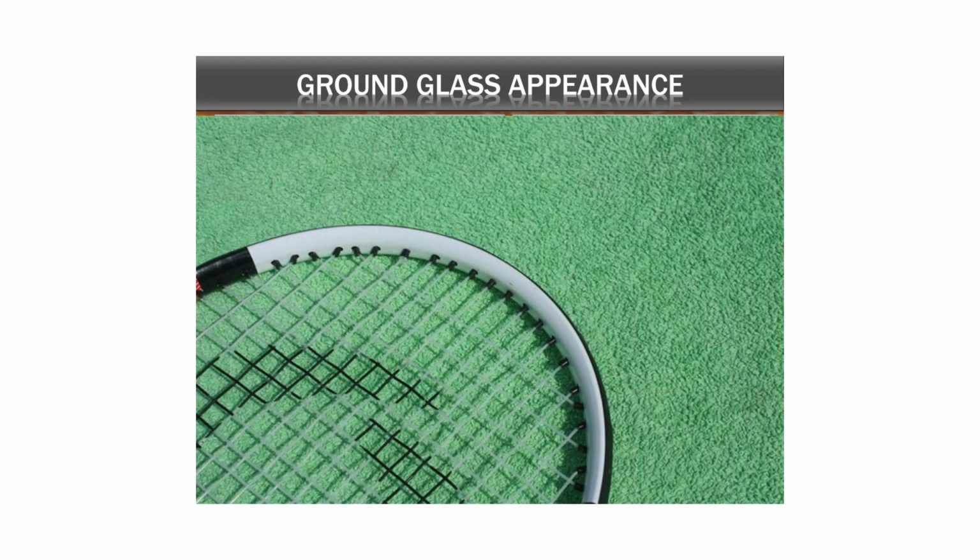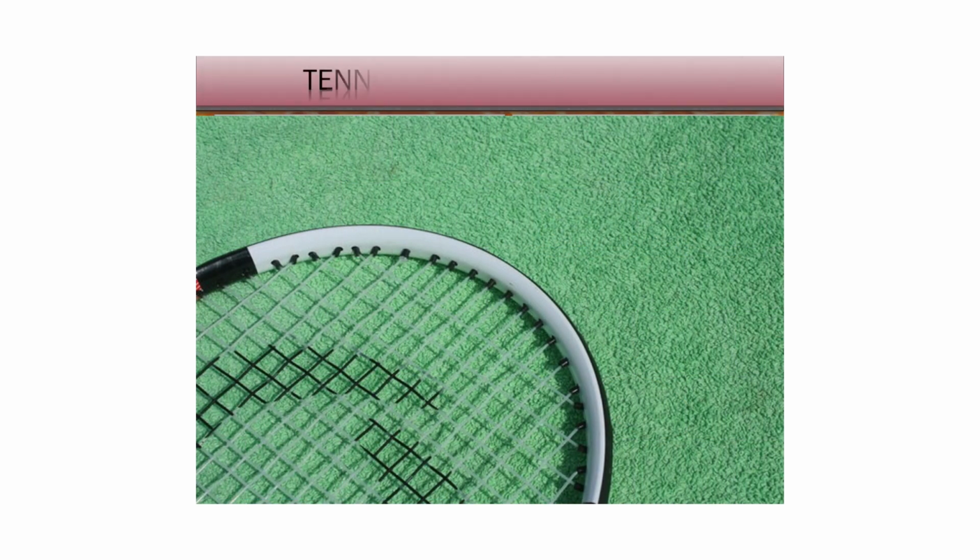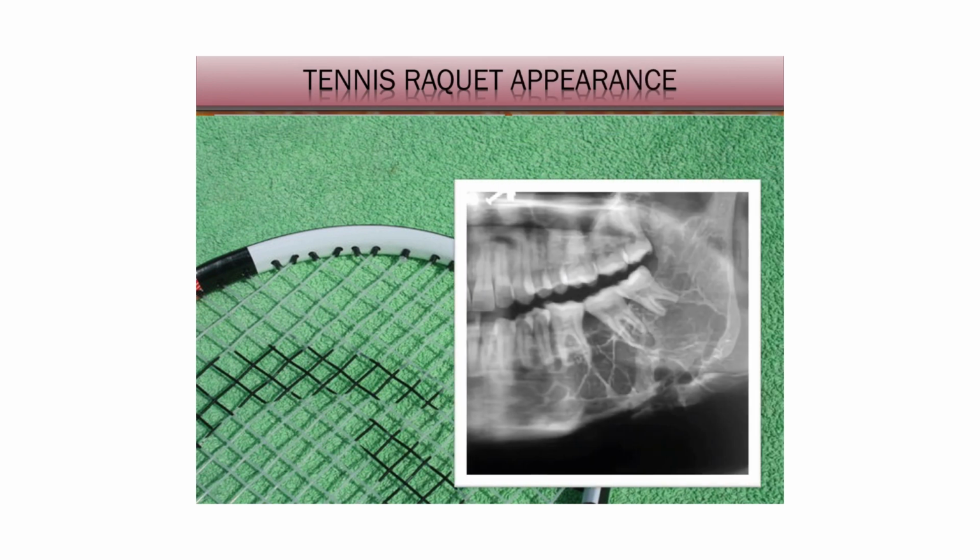Radiolucent multilocular lesions presenting with angular compartments that result from development of more or less straight septae is characteristically seen in odontogenic myxoma.